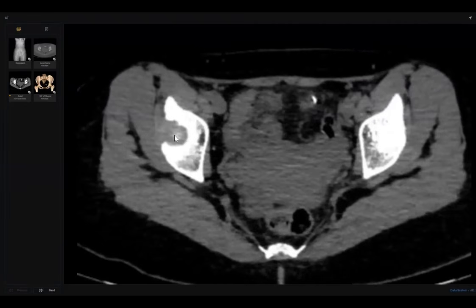What's your diagnosis? So this is uterine perforation, sir, with a perforated intrauterine contraceptive device lying outside the uterus, and this is an emergency. We'll need urgent laparoscopic retrieval and urgent referral.